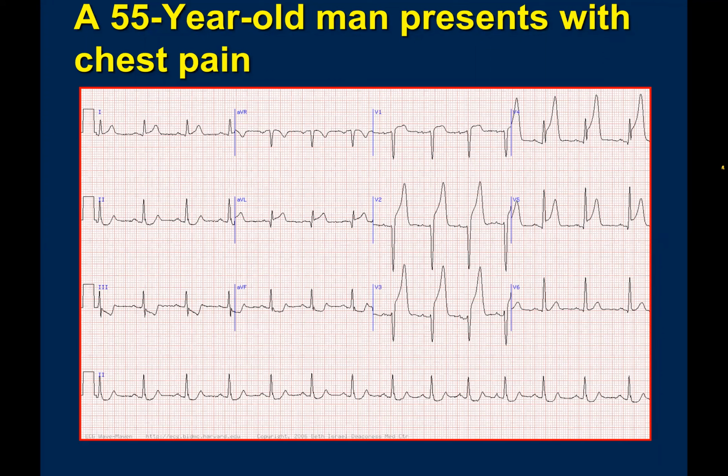So again, it's the LAD, left anterior descending artery, but it's an extensive myocardial infarction. As you know, V1, V2 is the septal area, V3 and V4 anterior wall, V5 and V6 lateral. In this case, you have V5 but you don't have V6, so only one lead. You have to have 2 leads from the same area. But if you look at the high lateral leads 1 and AVL, as you clearly mentioned, there is at least 1 millimeter elevation. So there is anterior and there is lateral, so anterolateral myocardial infarction. There are actually Q waves here, so you can call it an infarction by ECG.